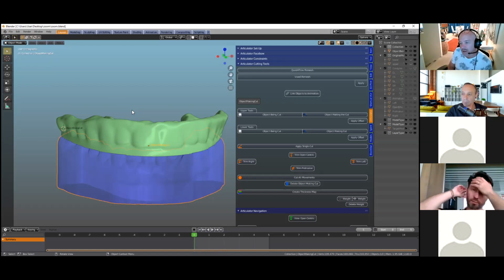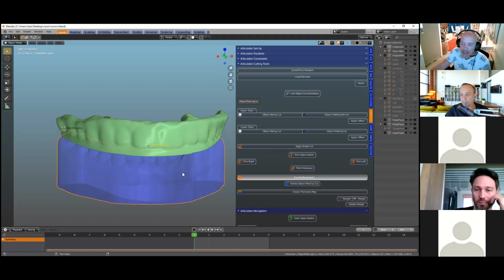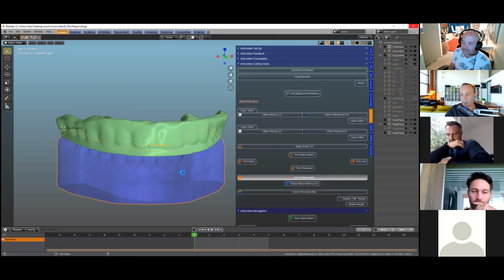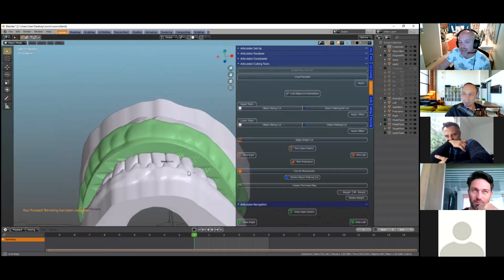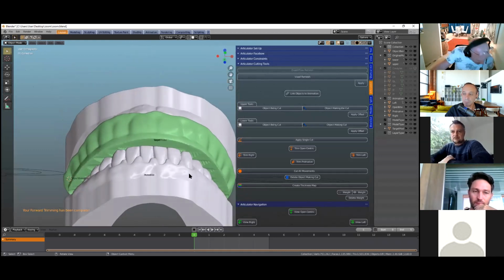Okay, so we're going to cut all the movements now. Cut all movements. So, Michael, this is now taking all those animation key points on the timeline into consideration when you're doing this dynamic cut. Yeah, essentially what it's doing, it's taking all those keyframes, and there's 13 cuts.